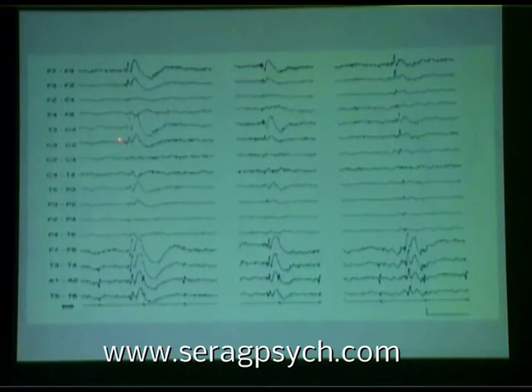Same thing here, C3 is slightly negative, but this isn't a left central spike because T3 is so much more negative. It goes way up to the negative C3. It's very negative. And notice that this spike is seen primarily at T3 and F7 with slight spread to T5. And then always, whenever you design a bipolar montage, you should try to have each electrode positioned in at least 2 places on the montage.